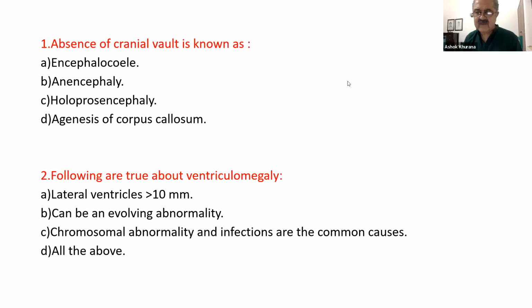Yes, you see, because some ventriculomegaly can be a normal variation, and some can have a very poor prognosis, for many years we've been trying to quantify ventriculomegaly and find out which one is associated with a poor prognosis. So the ones where any of the ventricles is more than 15 millimeters is referred to as severe ventriculomegaly, and that is definitely abnormal. Then we have the group that is between 10 and 15.